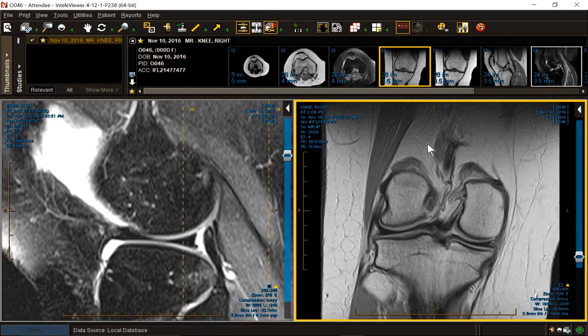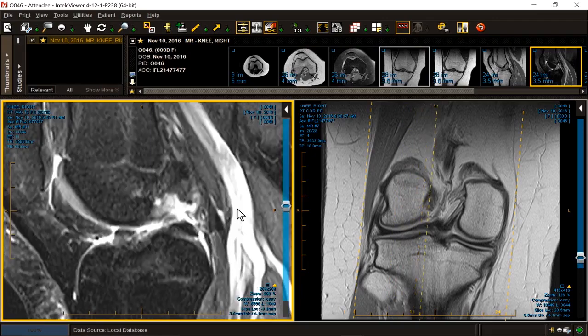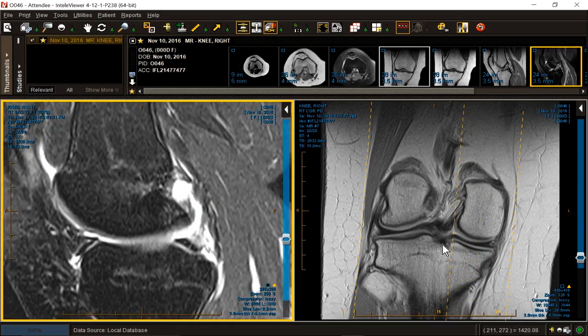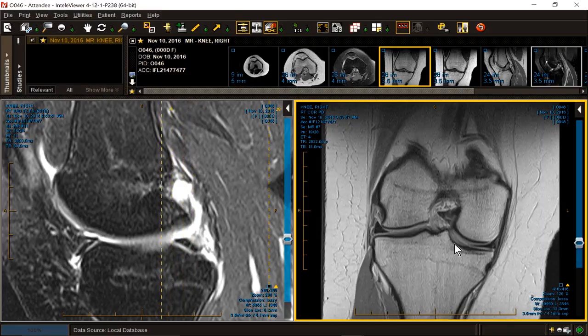All right, so we have a meniscus tear. It is a vertical tear with slight complexity, 2 to 2.5 centimeters in length, posterior horn to body. That would be number 2. Number 1, ACL transection, likely pivot shift mechanism of injury with moderate size effusion, 2 out of 4. Menisci otherwise spared. And then while you're looking at a case like this in the body, you should examine the meniscotibial attachments, which are intact. That would not go in the conclusion.